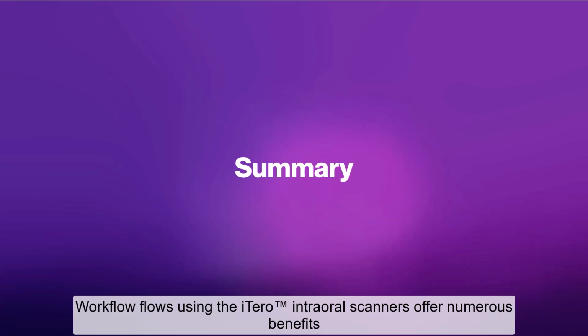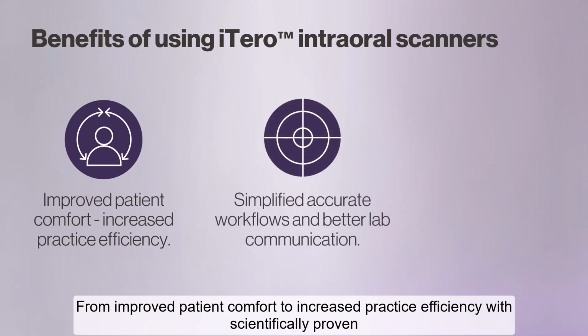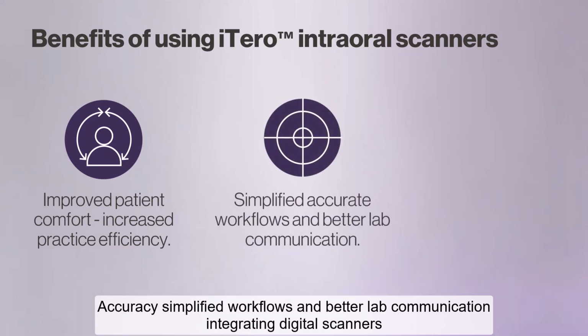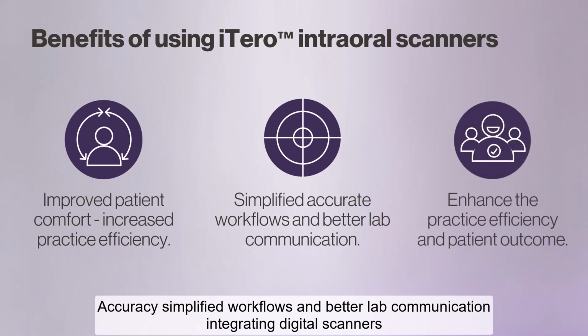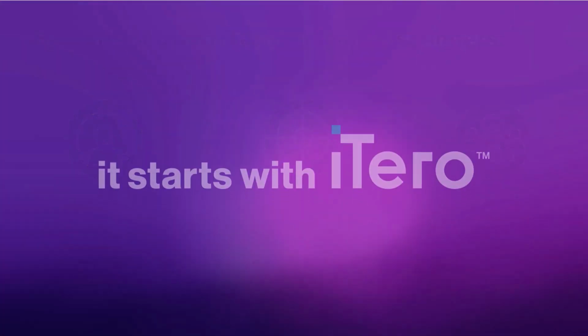In conclusion, digital workflows using the iTero intraoral scanners offer numerous benefits, from improved patient comfort to increased practice efficiency. With scientifically proven accuracy, simplified workflows, and better lab communication, integrating digital scanners with iTero can significantly enhance your practice efficiency and patient outcome. It starts with iTero.